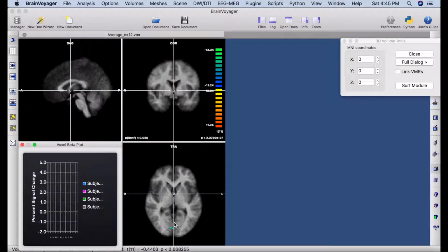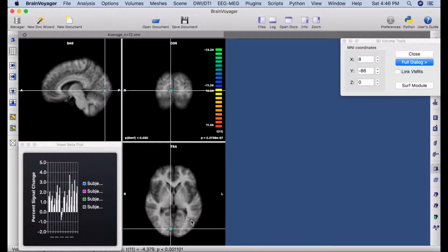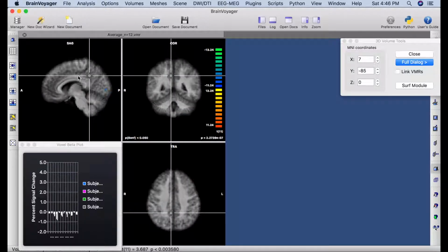As you can see, the Bonferroni is a highly conservative test. Very little data has survived. Here we will highlight the only small portions of activation that have survived the Bonferroni test.